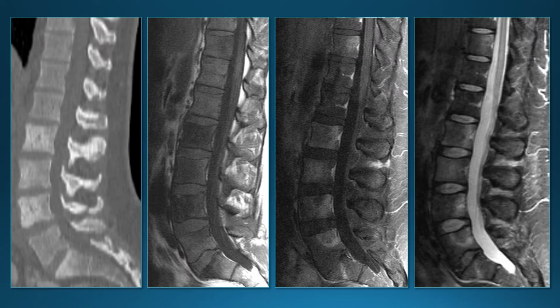I just want to show this. This is also a patient with sarcoid. It can involve the bones, so you can have involvement of the vertebrae. It's not very common, but on the CT on the left, we can see sclerotic lesions in several vertebrae. Kind of looks like the same thing you might see with sclerotic metastases. Here's the T1 low signal in multiple lumbar vertebrae. After contrast, the dark areas enhance. On the right is the STIR image. Really looks like vertebral metastases.